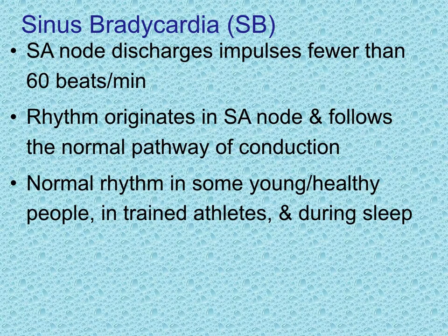One of the first dysrhythmias that we're going to talk about is sinus bradycardia. Sinus bradycardia still originates from the SA node because it has the prefix sinus. When you're considering anything that you're classifying as sinus rhythm or sinus bradycardia, it has to indicate that the impulse generated originated from the SA node and it follows the normal conduction pathway. Otherwise, it would not have the term sinus.